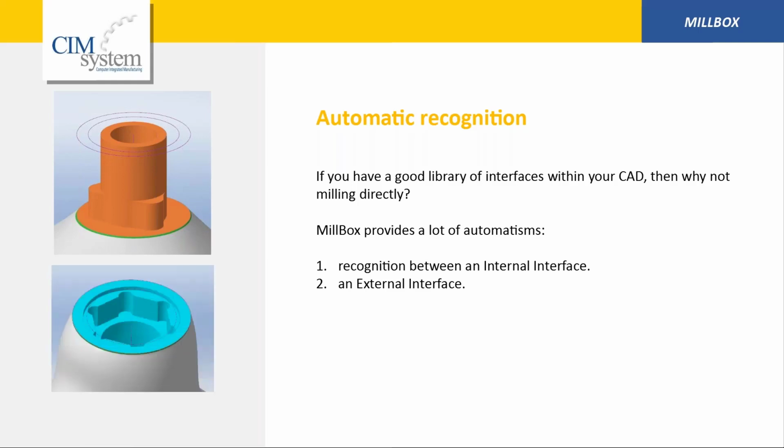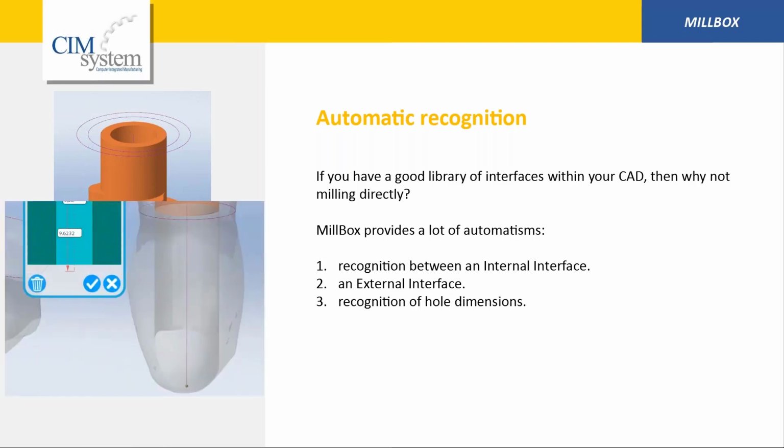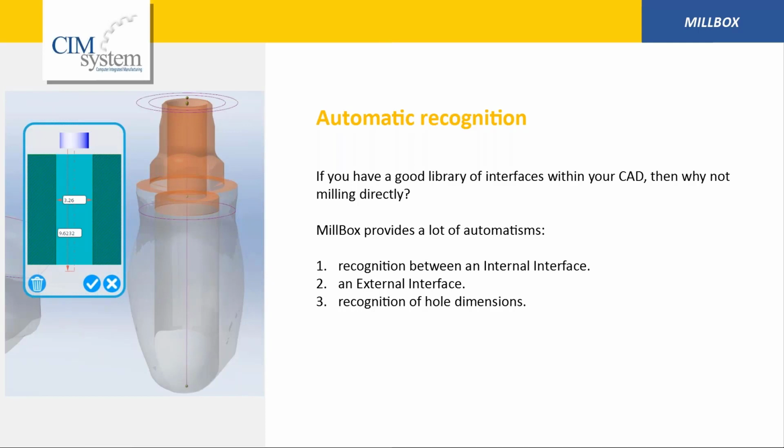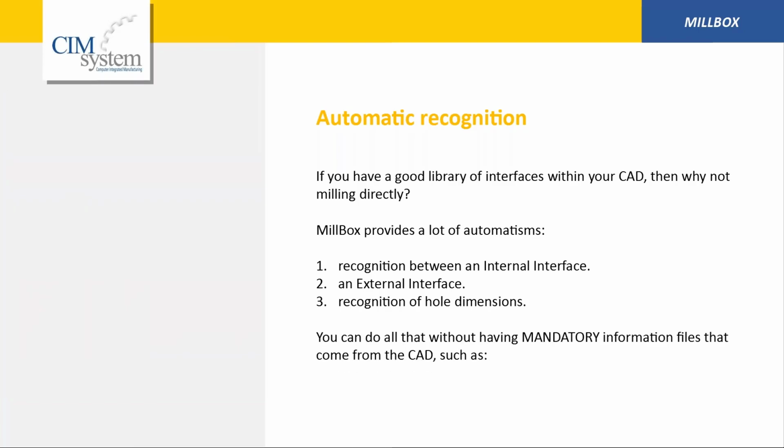External interfaces, like this one, and also the recognition of hole dimensions. It can recognize the diameter and the length of each hole. More important is that it's not necessary to have information files from CAD, such as construction info, PTS, HML, etc.